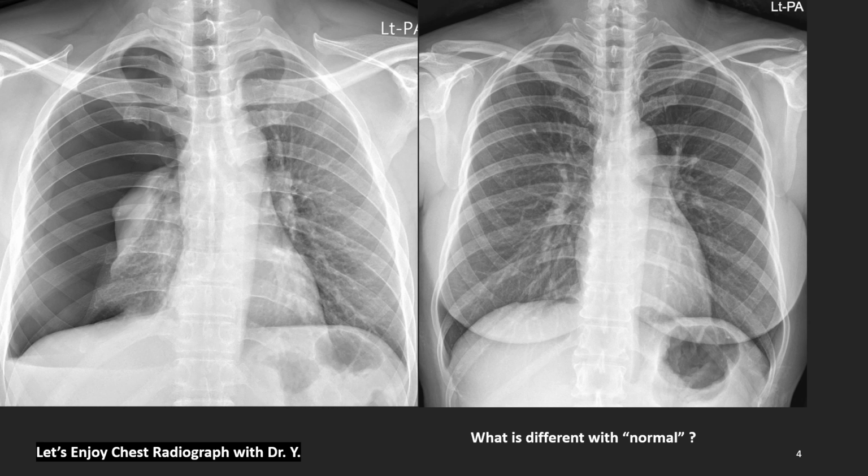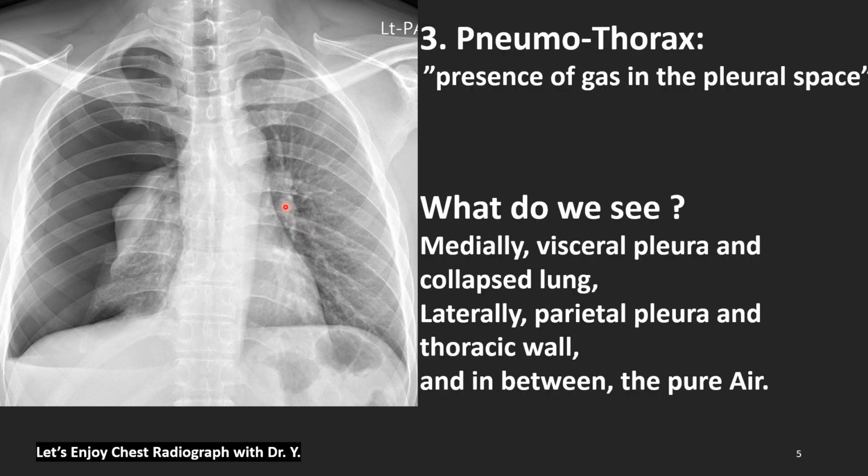Yes, it's very easy for you. Yes, we all know this one. What is abnormal? Yes, the right side lung is abnormal. How abnormal? Although indescribable, we can say that this is pneumothorax of the right side. Yes, correct. It's thrilling to start with abnormal findings. First case. This is pneumothorax. Session number 3 is about pneumothorax.